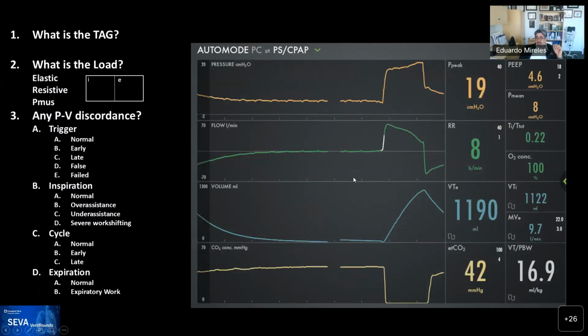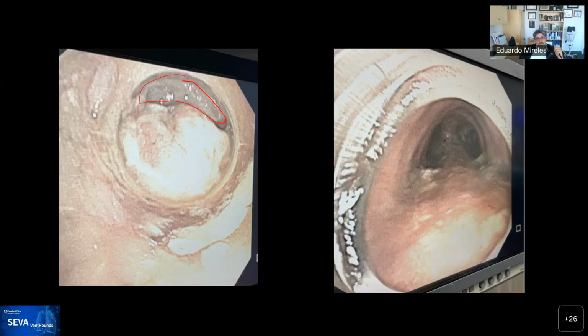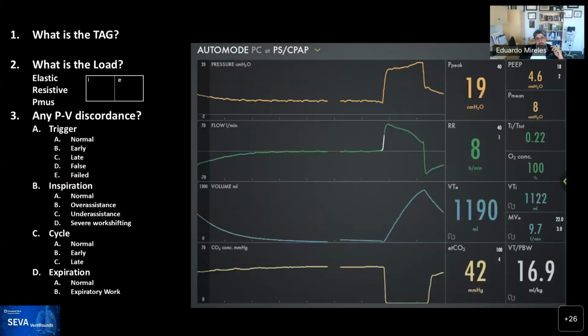And so I think this is the teaching point for all of you: when you have discordant resistances, something is wrong with the airway. Most likely there's an issue with the airway. In this case, it was a classic ball valve obstruction. This patient was on massive amounts of pressures and had a cardiac arrest because of that. He recovered and went back to recovery because it was recognized, but you can see how this could have escalated rapidly. So there's the image for you to remember.